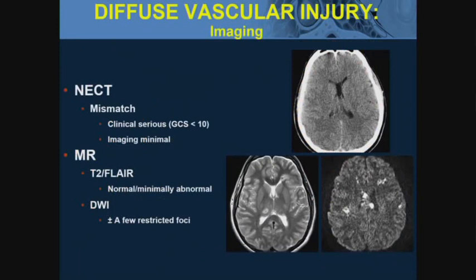When there is a discrepancy between what the CT scan looks like, here's a patient whose CT scan looks virtually normal. You don't really see much of anything. Maybe you can say there's a little brain swelling. I don't see the sulci and the cisterns very well, but you don't see anything else. Glasgow Coma score, 5. So when there is a disconnect between what the patient's clinical score is and what the scan looks like, you can say we're simply not seeing what's underlying.